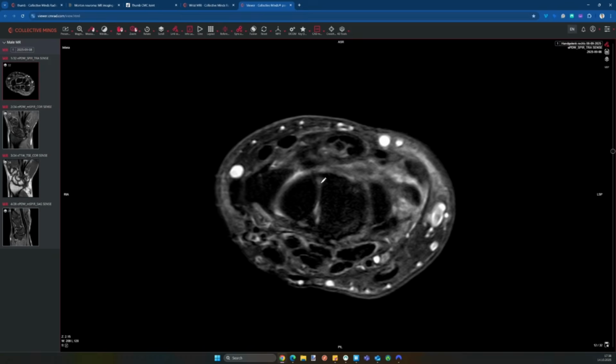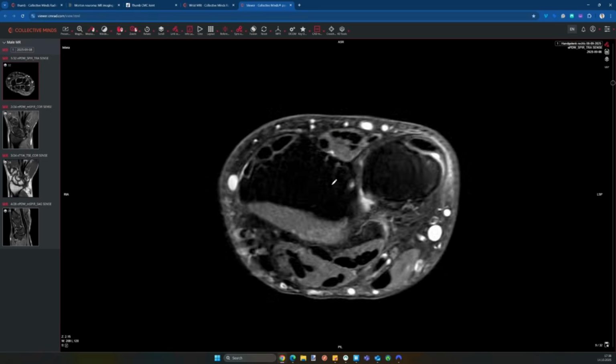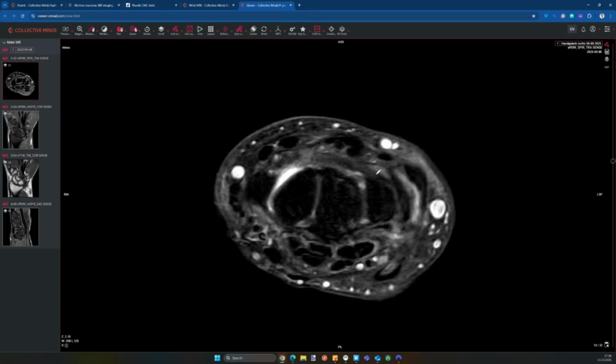And then the SL ligament is okay. The other extensor tendons, we don't see much there either. So we don't see too much. Maybe some subtle degeneration of the dorsal LT ligament. The volar one is fine. Volar SL ligament fine. Dorsal SL ligament fine.